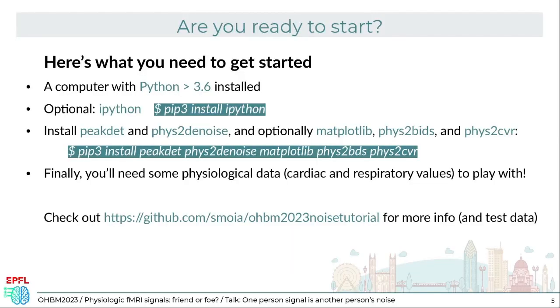Here's what we need to actually get started. You will need a computer with Python above 3.6 installed. 3.7 is great, 3.8 is great. Above versions should work as well.